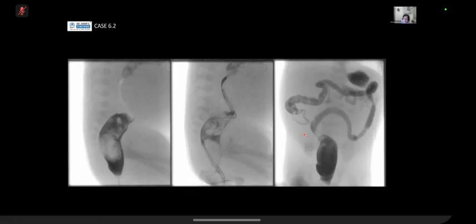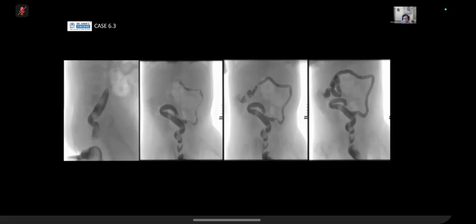Okay, so this one was also. Okay, yeah, right. So the case 1 and 2 are the same. They are features of meconium plug syndrome, or small left colon syndrome. And we'll talk about that. And then case 3, what do you think?